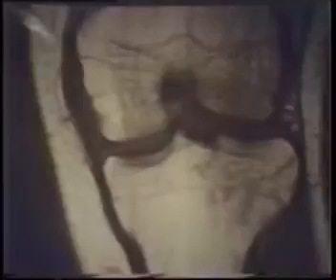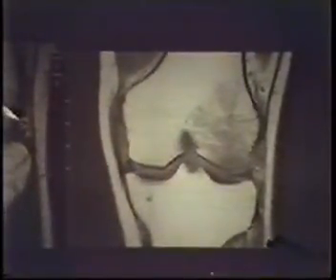Now, this is what it looks like, and it's surprising how easy this is to miss if one isn't aware of it and doesn't look for it. Notice that this is the normal area. Notice all these linear areas of low signal intensity here, also the loss of signal intensity within the femoral condyle, and very typically on the other side of the knee there is a collateral ligament tear. The reason for this is this patient was hit here. This is a classic clipping injury in football, by the way. The patient was clipped from the lateral side. Before the medial collateral ligament ruptured, there was enough compressive force on this side of the knee to produce the bony injuries.